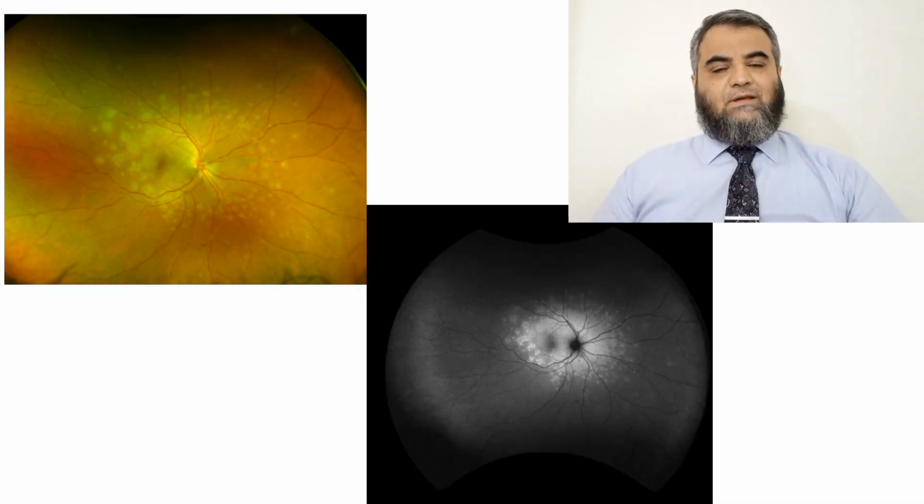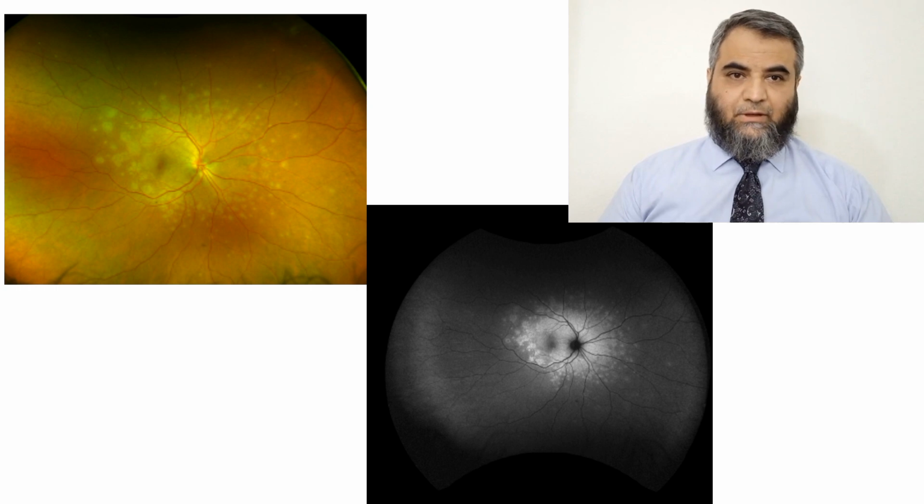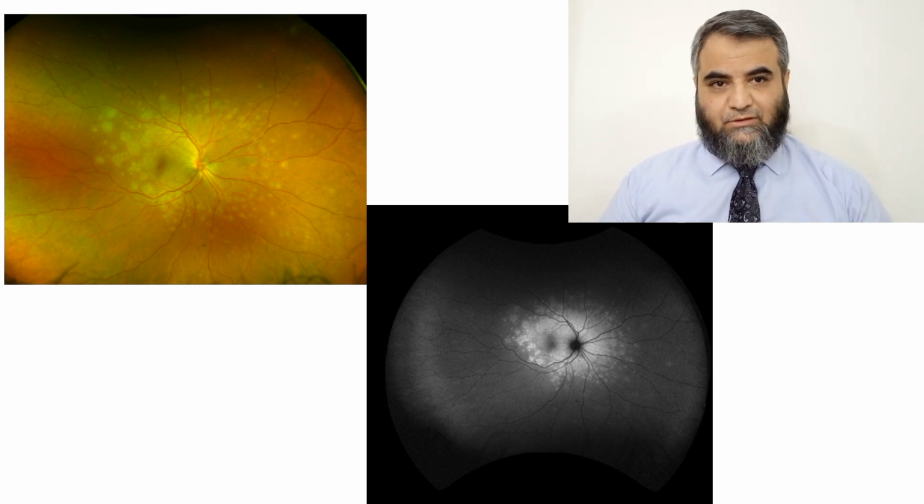In this slide, we have used the wide field Optos camera, and you can see all the lesions in the macular area, also occupying the nasal side of the retina. These are all active, yellow, round lesions. Autofluorescence is also very helpful in diagnosing these. In active lesions, we will find moderate hyperautofluorescence, as shown in these photographs.